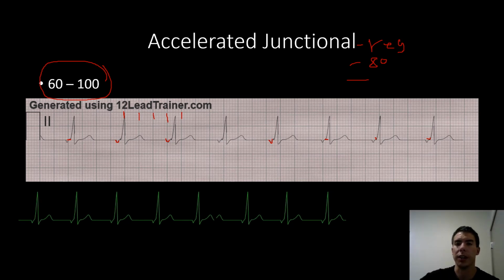It shouldn't do that if it's a Q wave, so that means these are P waves. So P waves are inverted. Just say P inverted.